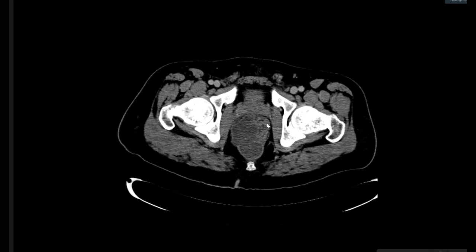So, sticking to this single pathology, which looks like a fluid-filled cystic-looking lesion involving the rectum, the lumen is not very clearly visible to me. Maybe it is displaced or compressed due to this lesion. There is also slight expansion of the right lateral wall of the rectum. Next, I would like to see further images, and other projections if available, like coronal and sagittal images.